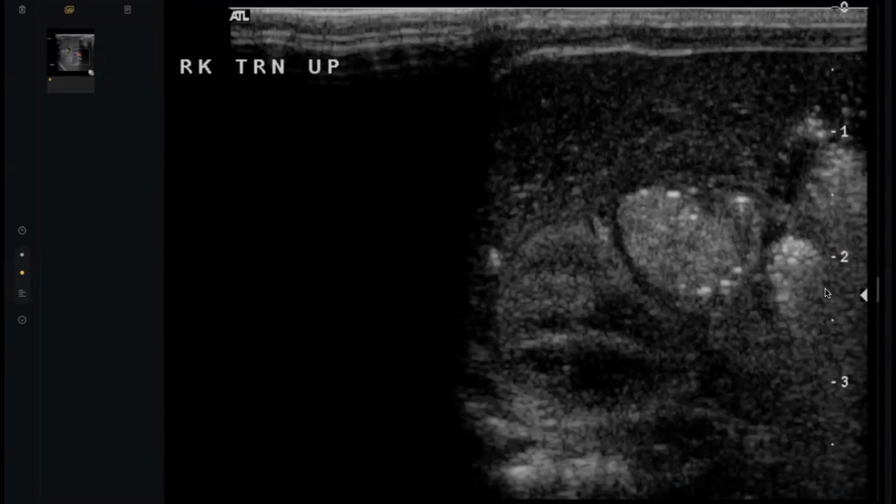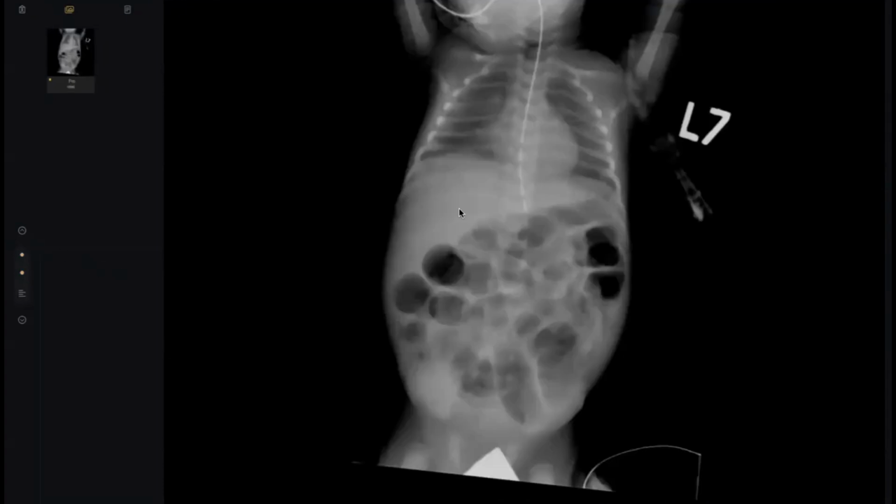No, that is why I ask you. Why? What else? Bowel perforation. Only one sign here in the X-ray. What is the most dangerous sign?